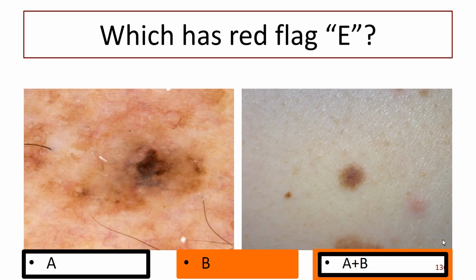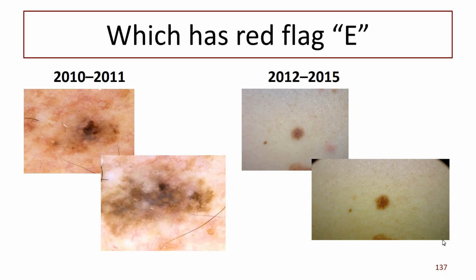Can I remind you that if you don't know or it doesn't, the answer is like this. Could I have you all doing this, please? You can't see E on this picture. E is for evolution or change. Now you can. So this has changed to this.